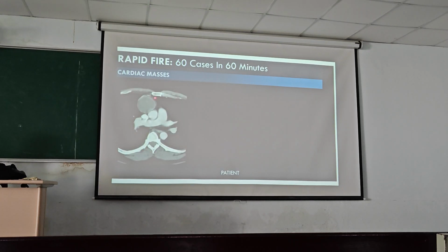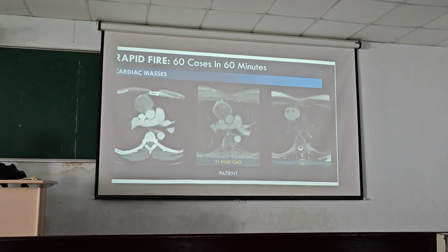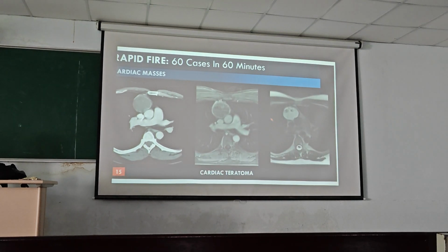And then this is a very scary case. It looks like... no, actually no. This is a teratoma under the heart.